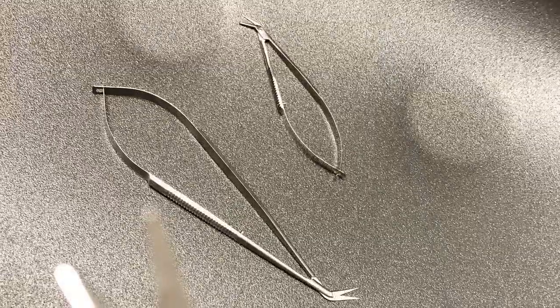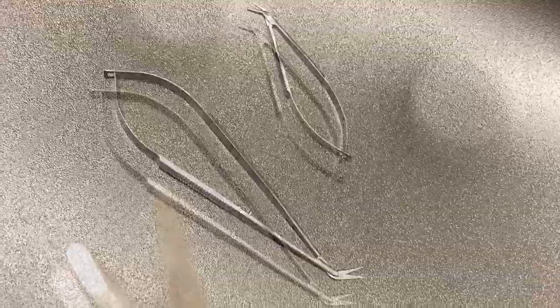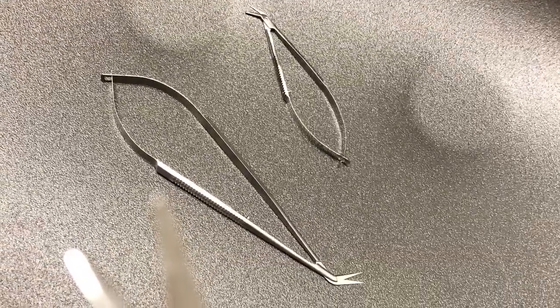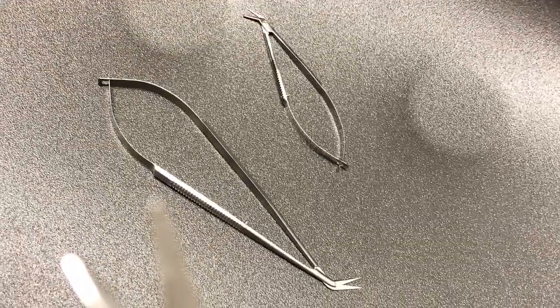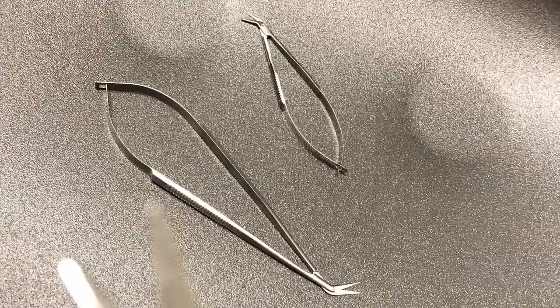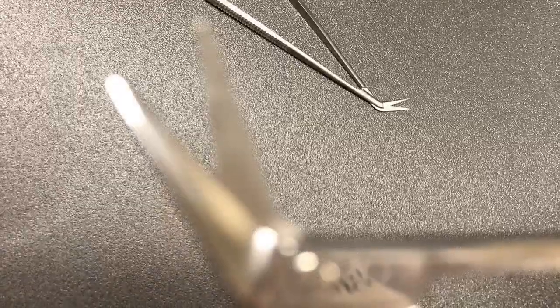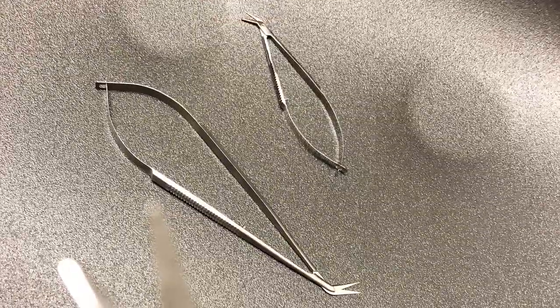Potts scissors. Usually used for trimming and opening of vessels in cardiovascular and thoracic procedures. Various sizes are shown in our instrument sampling. They're used based on the surgery and tissue or vessel size. Many times you make an arteriotomy in a vessel with a sharp knife, and then you use Potts scissors to further open the vessel. Their angled shape facilitates this.